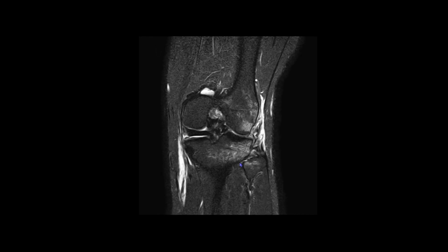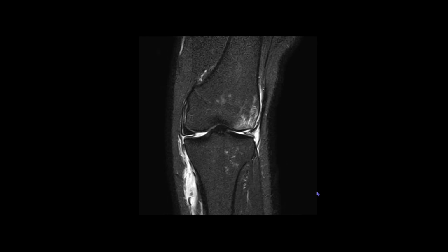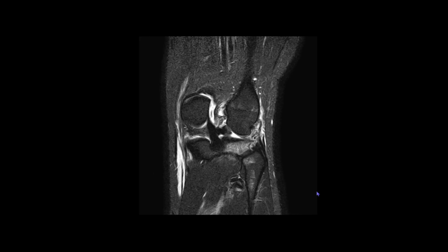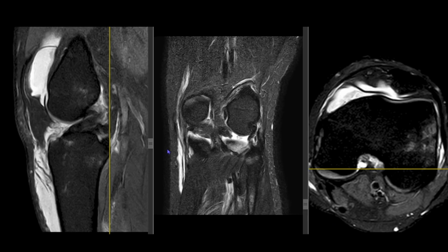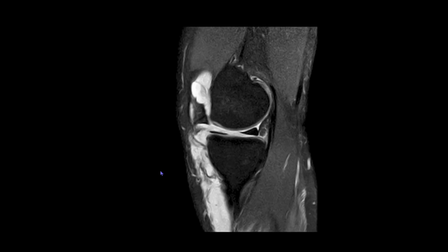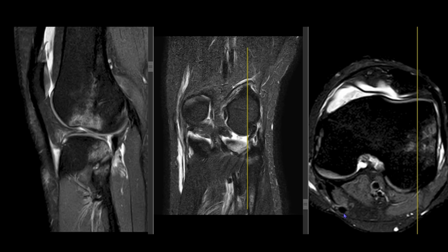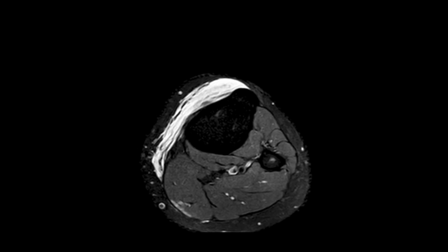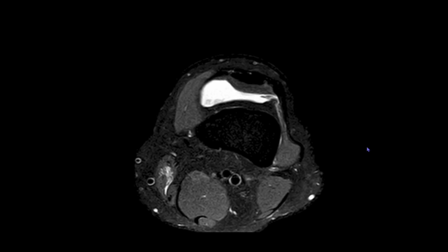There are multiple marrow contusions, the pattern of contusion corresponding with the ACL injury. Also seen are the contusions in the proximal fibula, and there is significant posterolateral corner injury. So it's injury to the posterolateral corner structures, and there is extravasation of the joint fluid outside of the joint. So this is an extensive report which occurs in a patient with a road traffic accident. Thank you.